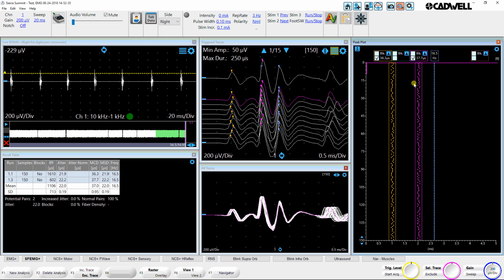So now we're just looking at 3 peaks. If we want to adjust the window size, you can drag down if you don't want the first samples included, or you can drag up, or you can drag left or right to exclude or include any outliers. In our all traces window, this is where you can draw an exclude box, and anything in this red box would be excluded. So you can draw an exclude box.